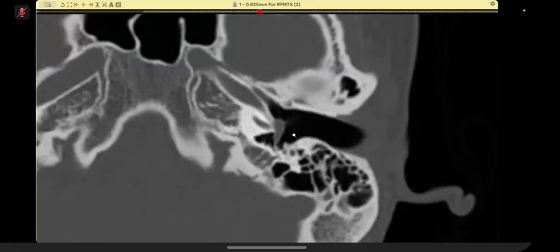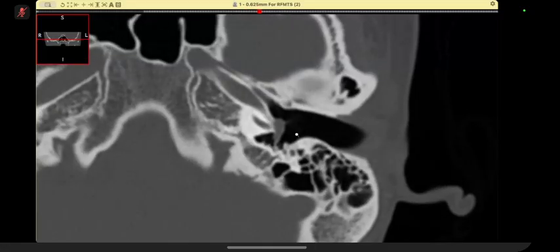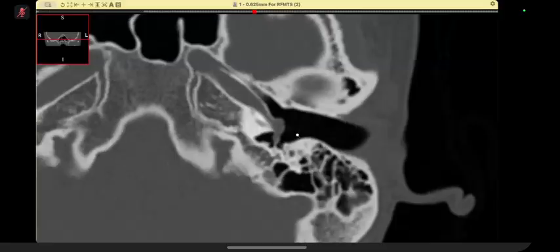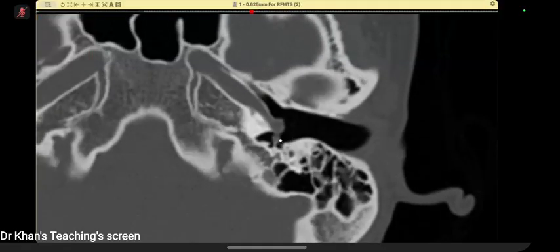I don't think so. This case per se is an FRCR level case. It is slightly more specialized, so I don't think it will be for your exam. Having said that, it is a beautiful case to learn anatomy. So this is where we start.